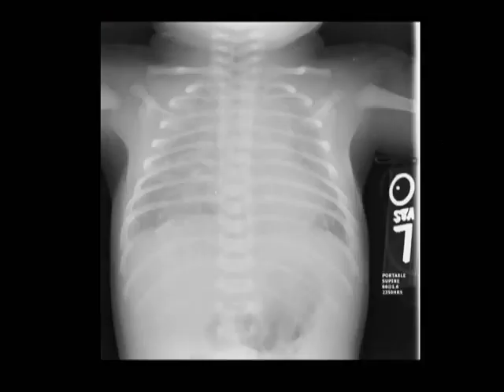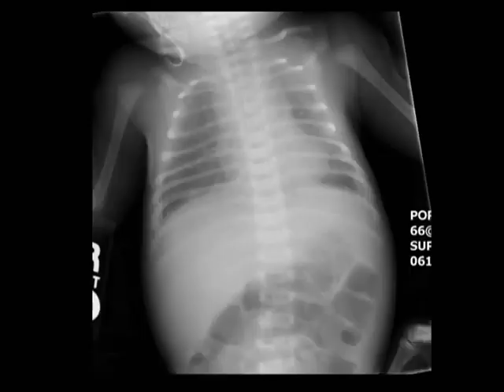So here's a baby that has nearly opacified lungs. They have small pleural effusions, and the heart is a little generous, and there's vascular congestion. Retained fetal lung fluid or transient tachypnea of the newborn is really a diagnosis of exclusion. You have to think about it, and there is a normal process of the lung fluid clearing, but it's only after 24 hours, and you can see that there's marked improvement, that you can say that it's retained fetal lung fluid and not pneumonia or some other diagnosis. So with this, you'll see very rapid clearance.